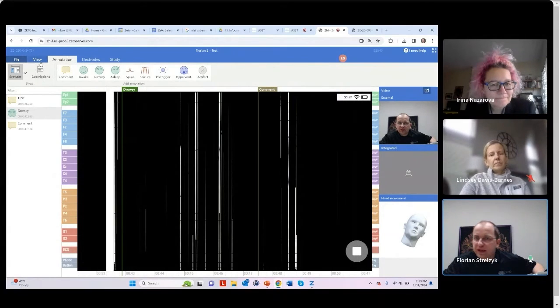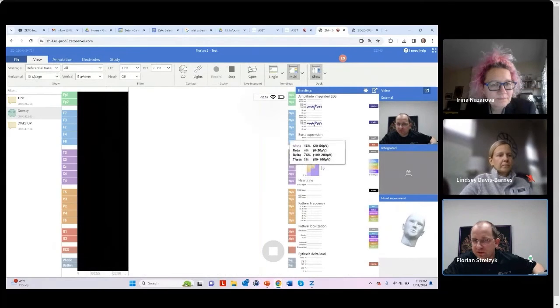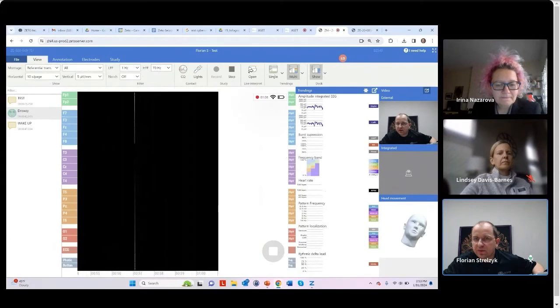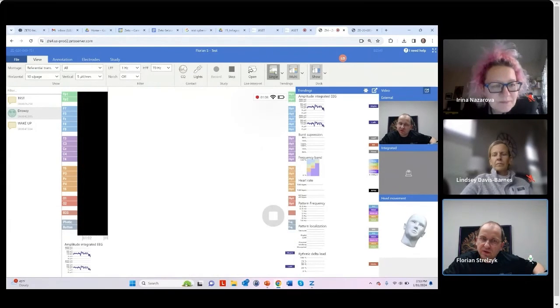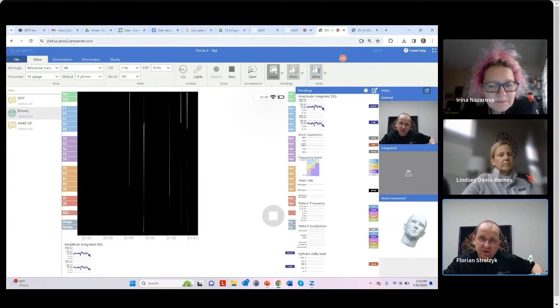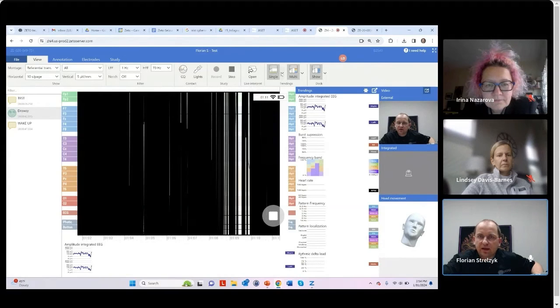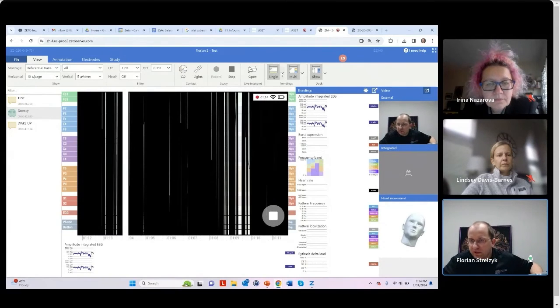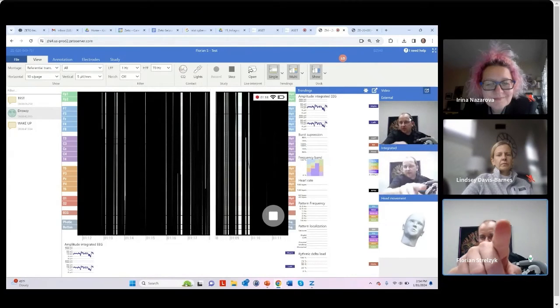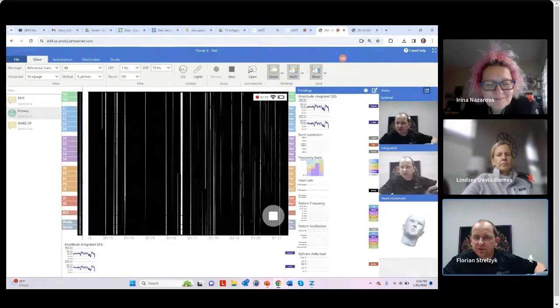We have real-time trendings here also. Obviously now they're going to be a little bit weird because it's not real data, but you see here in real time where the trendings show up. So the user interface for live real-time recordings is identical to that of offline recordings, so it makes it very trivial to interact. And actually, I have 2 camera streams on here right now. I have 2 cameras. One is my integrated camera, the other one is my USB camera. It just works out of the box pretty nicely.